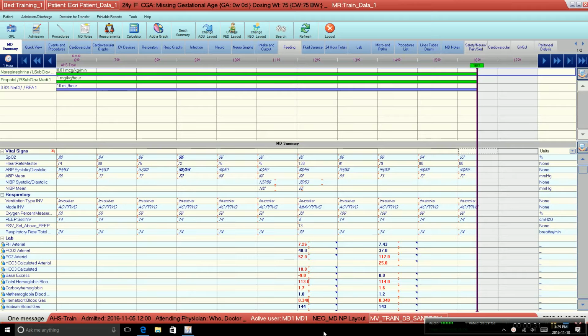It's built around the concept of a patient's flow sheet that gives you all of the ongoing vital signs of the patient as well as relevant information being collected. This is meant to be used as an overview of the patient and doesn't include all of the information available in the patient. If you want more information about specific details of specific parameters, then you have to dig deeper into the parameters through all of the different tabs where this information is being kept.